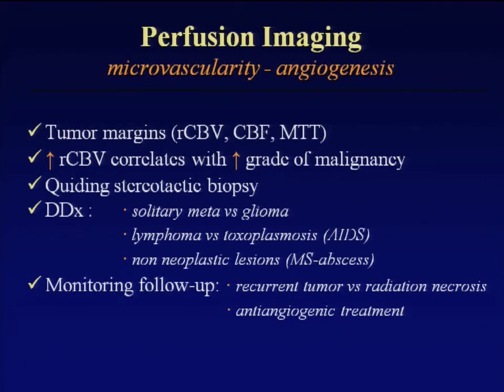When we check the contrast in the patient, the areas of the tumor which enhance reflect areas with breakdown of the blood-brain barrier. The areas of increased perfusion reflect vascular proliferation and the development of many vascular networks, imaging findings much more specific for the presence and the grading of the tumor.